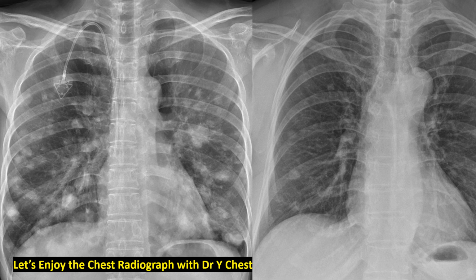Let's enjoy the two hematogenous metastasis cases. First, the left one: many, numerous, bilateral, round, variable-sized nodules, bigger and more dominant on the lower lung zone. Colon cancer metastasis. And how about this one? Not many, several, relatively uniform-sized lung nodules. This is also from colon cancer.